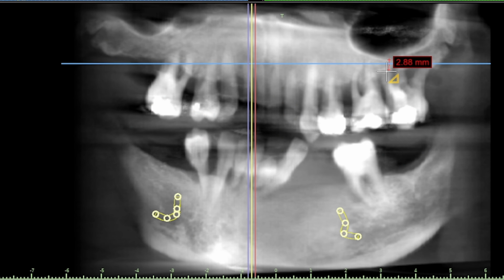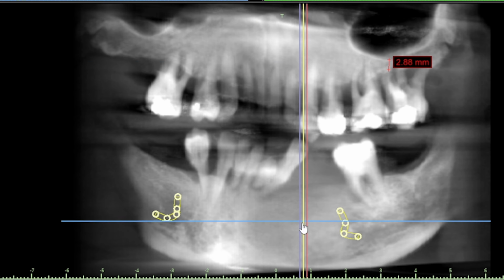Now, at the top, the planning is actually not too complicated, especially in this case. We do have loads of bone. If we didn't have a lot of bone, there's more complicated implants we can start looking at. But let's keep it simple because I'd say 70 to 80% of cases are relatively straightforward. We've got enough bone. Now, if we look at the bottom, at the bottom we've got different challenges.